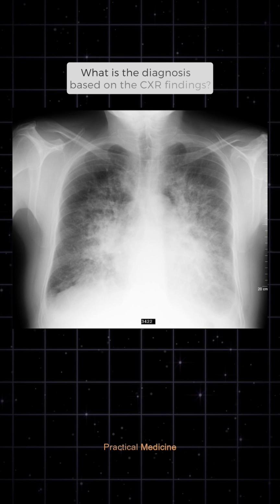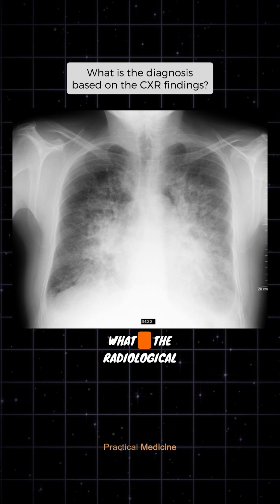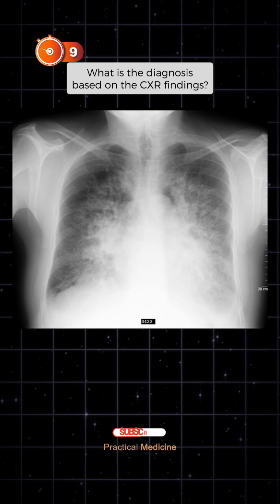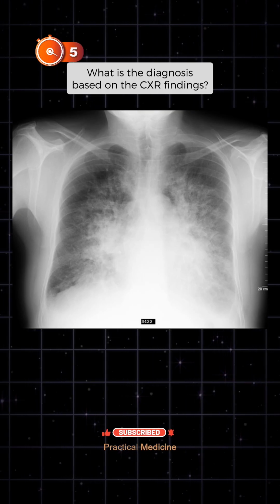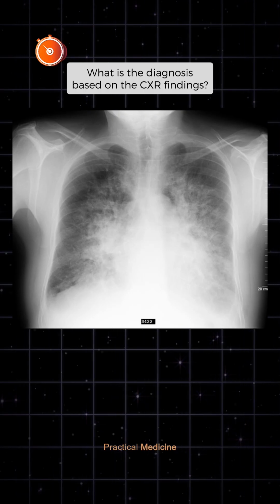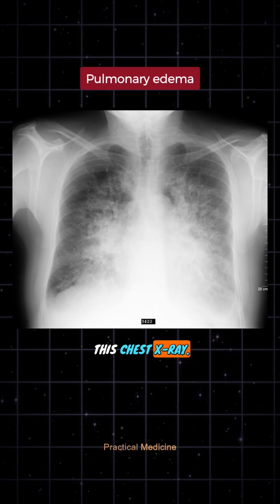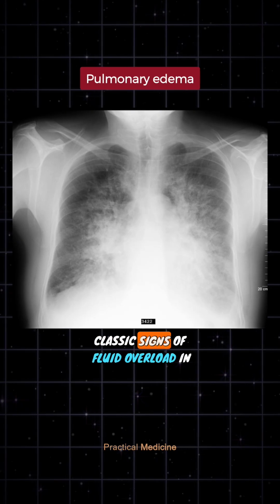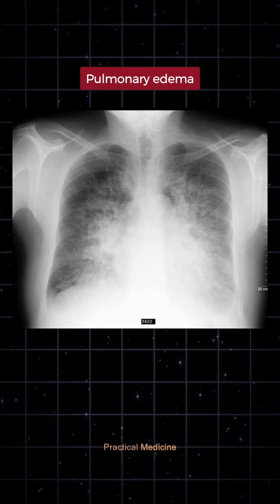This patient had shortness of breath and orthopnea. What is the radiological diagnosis? There is severe pulmonary edema on this chest X-ray. Pulmonary edema on chest X-ray shows classic signs of fluid overload in the lungs, vital for quick recognition in emergencies.